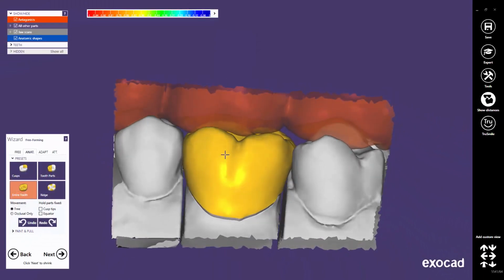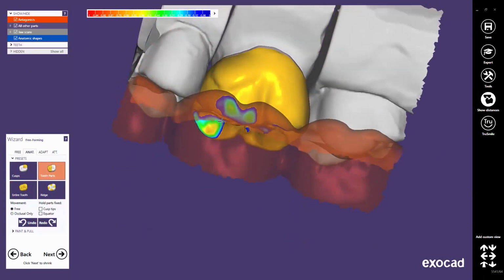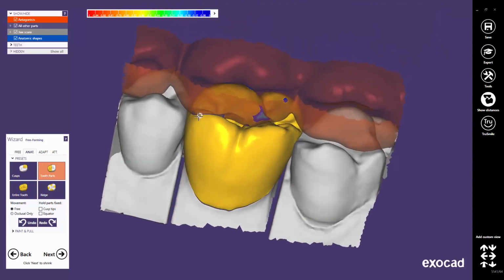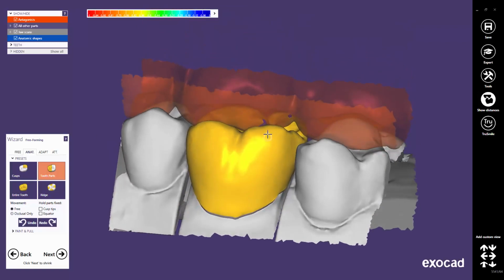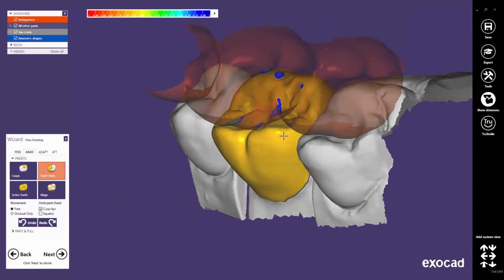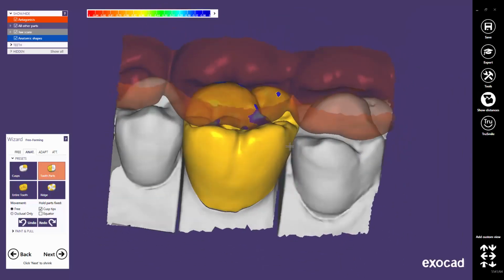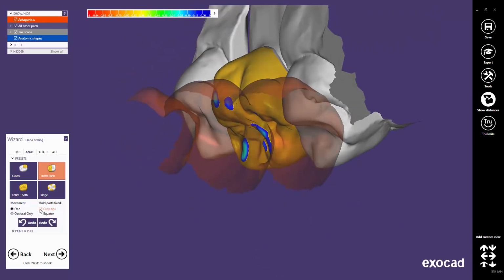Now you may use all the anatomical freeform features to create contact points with the antagonist. Don't be too critical with the design of the contact points. In another step, they can be adapted accurately. When the contact points are done, keep the cusp tips fixed while freeforming on the tooth sides to maintain them in contact. It is very useful to keep the distances visualization activated.